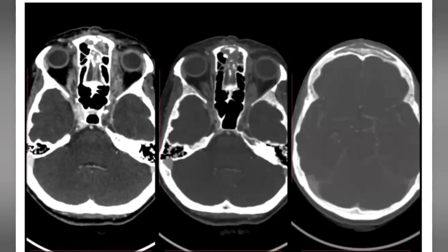So your diagnosis, please. Sorry, we can't hear you. Can we give this film to somebody else, or should I just explain it? Okay, 68. 68.